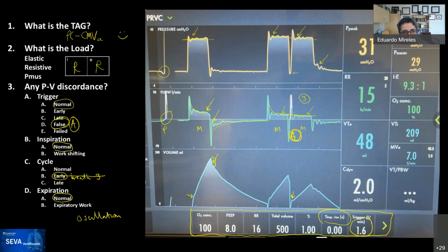We're going to see an example in a second, but a common issue with patients with high resistance is that people panic with the high peak pressures, and that leads to other wrong actions rather than looking at the patient: what's the auto PEEP and what's the plateau pressure rather than the peak pressure, which is only from the resistive component.